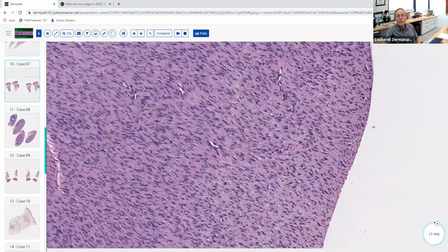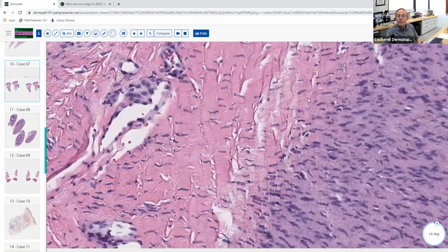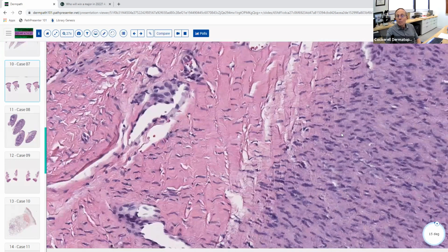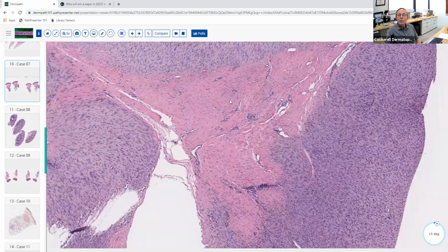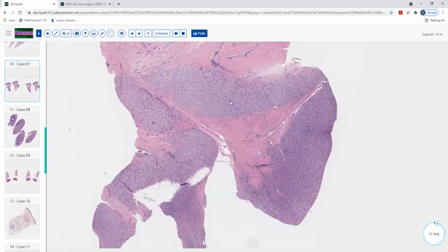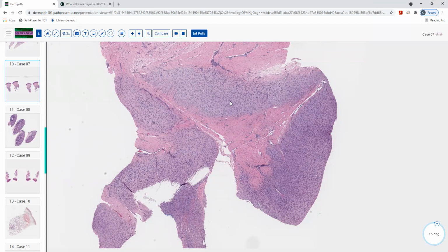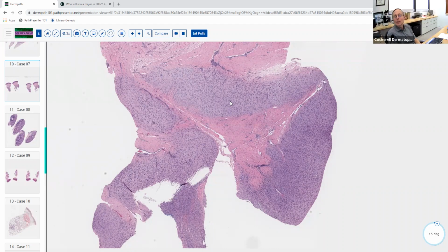And if we look over here, we see lots of thick ropey collagen bundles that are being formed from these fibroblasts. So that's exactly what they are. Based on all of that, what's your diagnosis here? Well, given that we are on acral skin and it seems to be a pretty well circumscribed fibroblastic proliferation, either palmar or plantar fibromatosis. Good. When they call it palmar fibromatosis, what's the other name for that entity? Dupuytren's contracture.